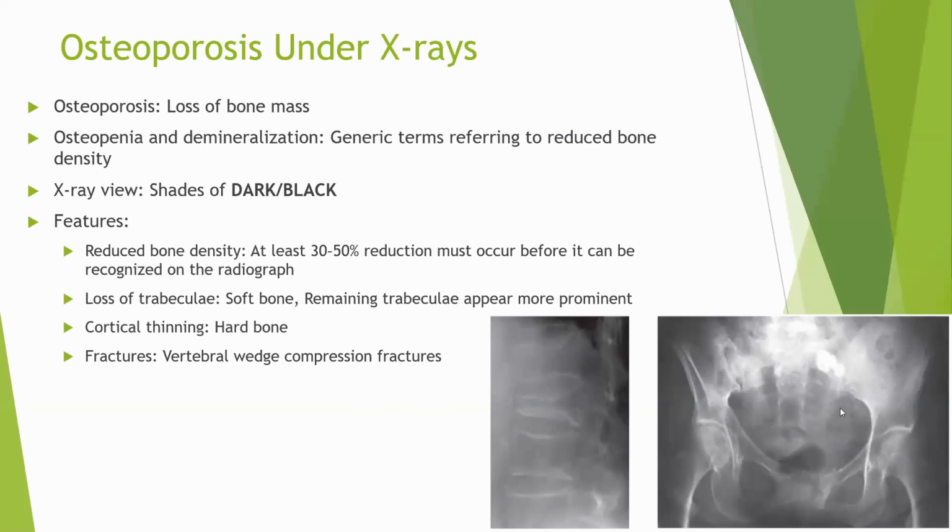Now, there are many things going on in this pelvis X-ray, but probably you notice two very, very glaring things. One, that there is actually a fracture in the pubic bone, a fracture in the left pubic bone.